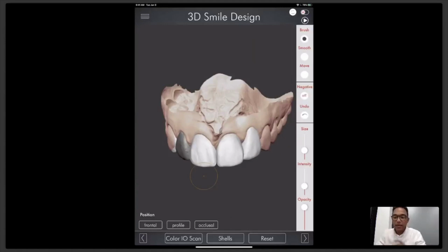So Josué is asking, what happens if this wireframe proportion doesn't fit perfectly in the teeth? Well, that happens as we believe that people are not 100% symmetric. So when you are in adjust shapes back into the smile, you can turn your symmetry curve off, and then you'll be able to adjust according to the face analysis of that patient.